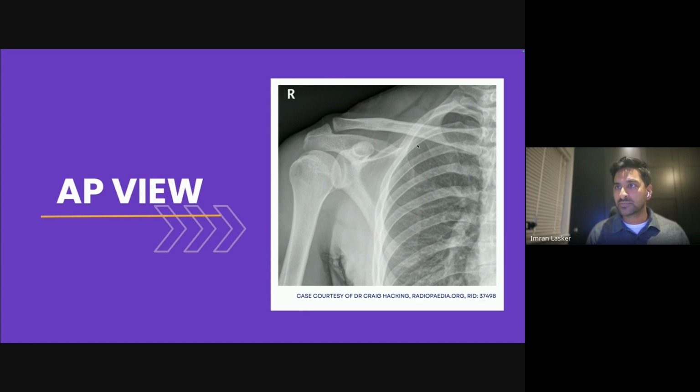But I always encourage people to try and draw. If you see a line that looks a bit abnormal, draw a line all the way around and just really follow it and see where it goes. And you can see that this goes from the lung to outside the body and then follows the scapula all the way around like so. So this is definitely the scapular blade.